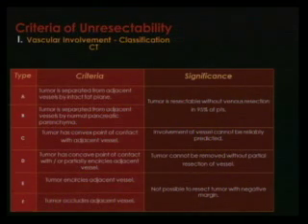arterial assessment, we have a classification for CT. You can follow this classification, and you can mention it in your impression. But sometimes it's difficult to differentiate if it's A or B and C, you know. Let's see what the book says about this.